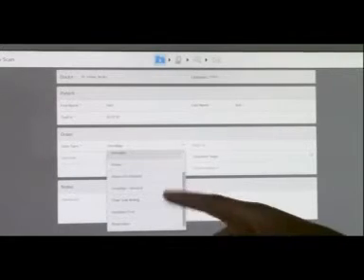You can scan with the wire taken out, scanning the patient with the brackets on, and then our lab will digitally remove those brackets. So the retainers can be made without the patient even taking off the braces, and when they come for the debond appointment, they can fit the retainers straight away.